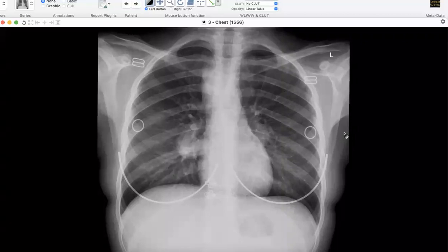So it looks like also another vascular, or it is continuity of this one. However, it is not so clear in the middle part. So it could be a venous anomaly, or this is a right-sided aortic knuckle, because I can see the aortic knuckle on the left side.